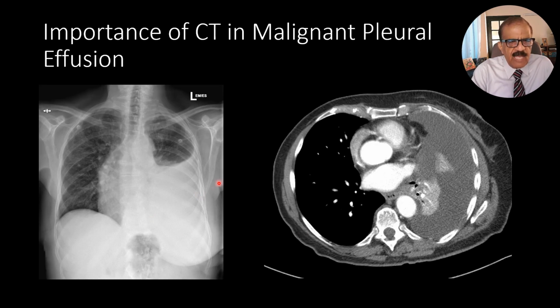Now this is the example. This patient has got large effusion. All the classical features of pleural effusion are there, and then you see the shift of midline also, trachea coming down, but here it is deviated to the right, it is pushed, and the heart border is also pushed to the right. So large pleural effusion with shift of midline structure to the opposite side, and trachea here is also slightly to the right side, but we don't see anything else.